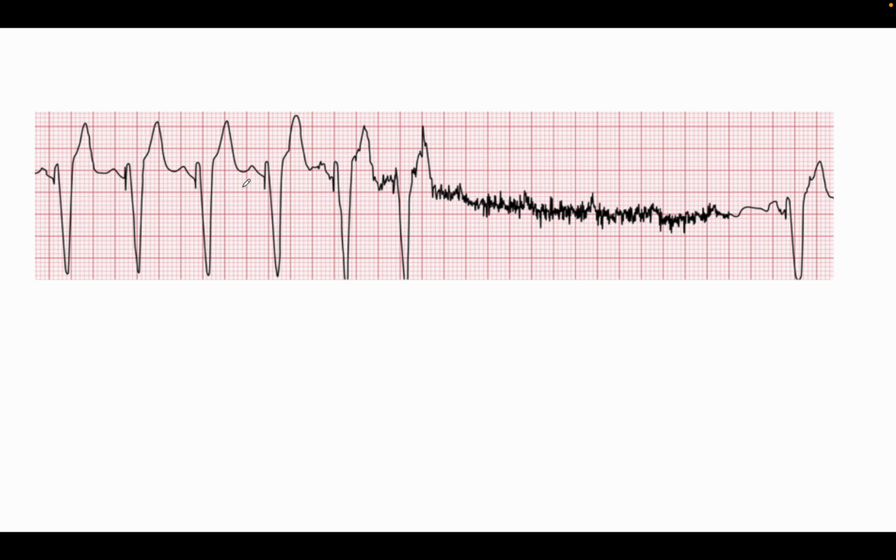So let's look at this example now. So we can see an atrial beat, which is not preceded by a pacing spike. So we know this is atrially sensed, and then it's followed by a pacing spike with a left bundle branch block QRS coming after it. So this is an example of ventricular pace again, with an atrial sense. However, if we start to move down, we see this area where there's no pacing going on at all. So what's going on here? Well, in this case, this is called undersensing. No, this is called oversensing.